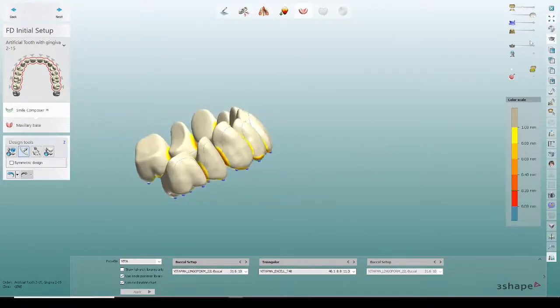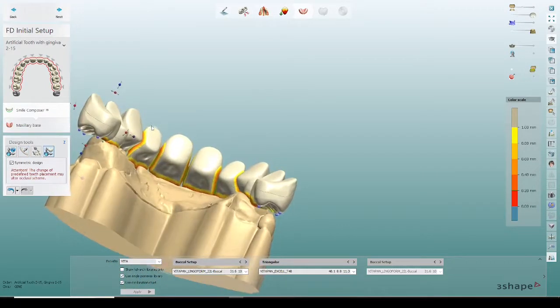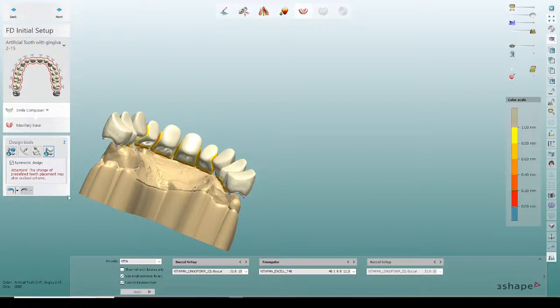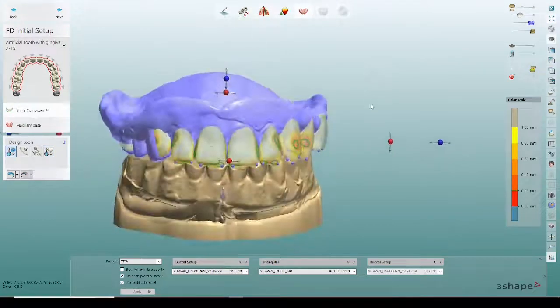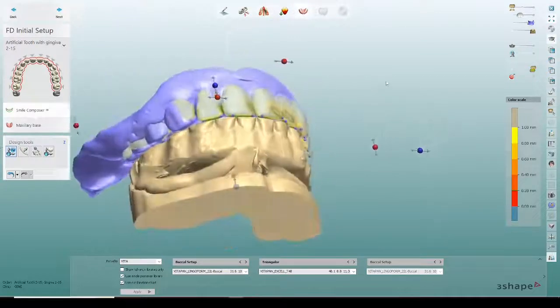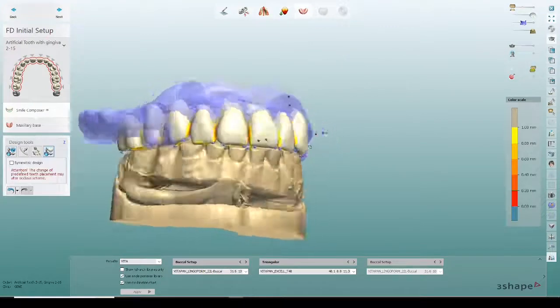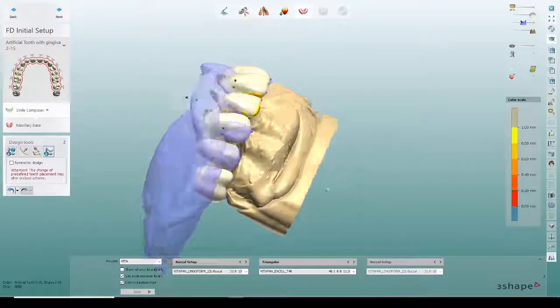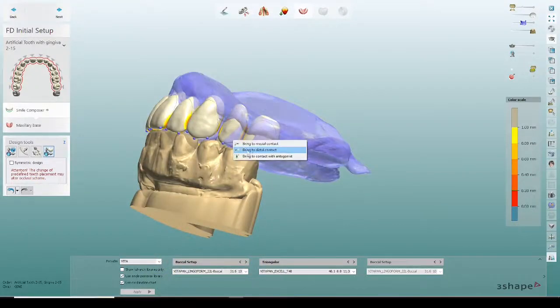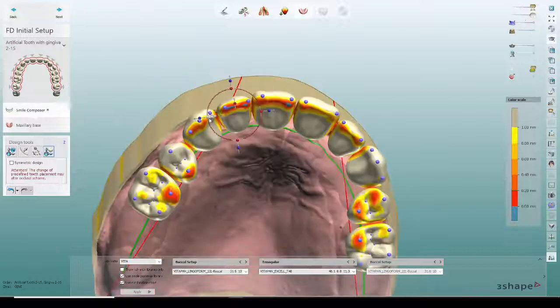And now I'm looking at occlusion. I'm going to have to move those teeth a little bit individually probably. I try to move teeth together sometimes, but sometimes I don't get the best results. So a lot of times I'll move them a little bit all together and then just individually adjust every single one to do that. So when I'm moving them forward like that, I'll do the whole chain. But when I'm adjusting occlusion, I'm going to have to move each tooth individually to get that fixed. As you can see right here, I'm adjusting to antagonist right here. And a lot of times I'll bring it to mesial.